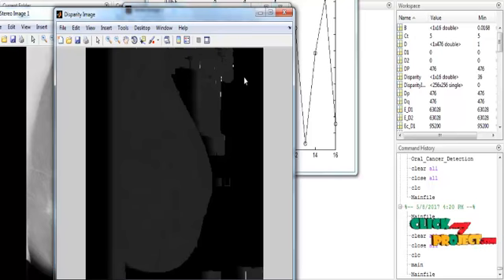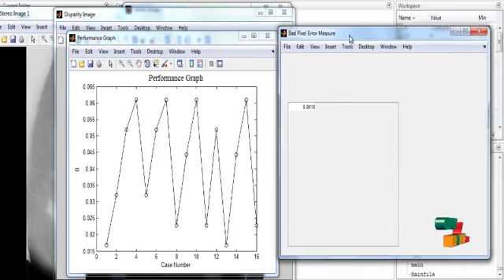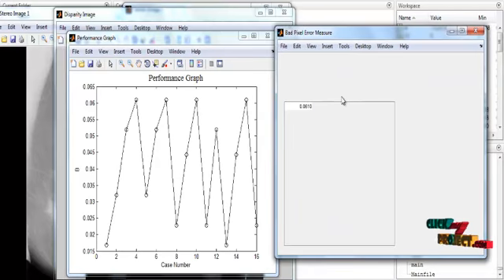Hence this is also known as the segmentation part. In the segmentation part, only the mammogram image is segmented and the other backgrounds are eliminated. The eliminated region pixel values will remain 0. Hence, the other pixel regions will have values in the range of 1 to some 150.